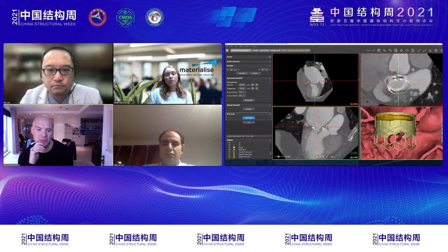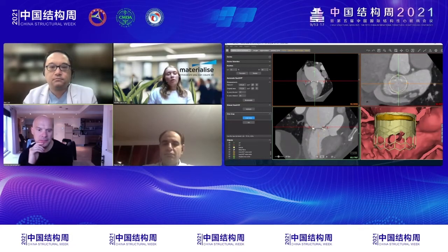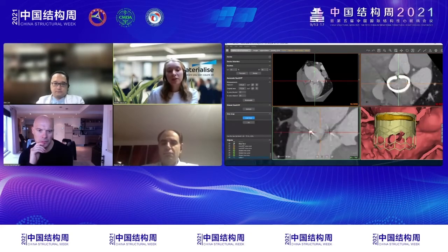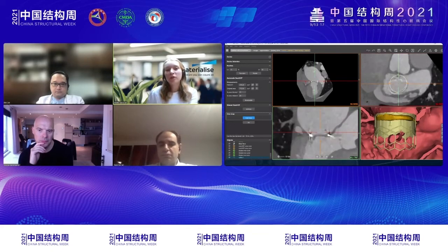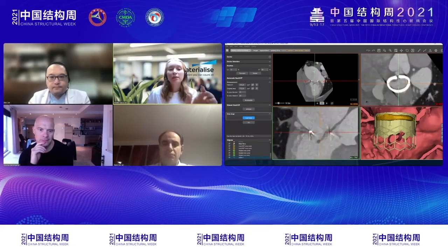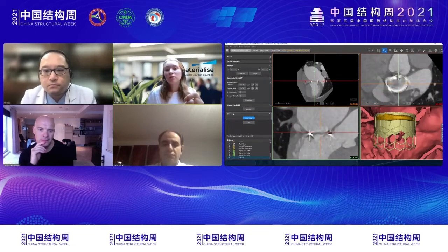Can you... And is that a reliable simulation then? So the thing is, the device positioning right here, you see that the device is rigid. So the device is not moving with the heart. So that's something you need to take into account. The device is placed like you place it and it stays in place right there. You can also see it here.